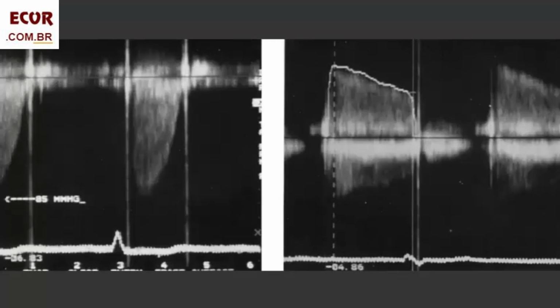The mean gradient in a mitral prosthesis may be important if higher than 8 millimeters of mercury. I don't feel quite secure to subdivide in moderate or severe when in mitral position, but for sure, the farther it is from 8 millimeters of mercury, the more assurance.